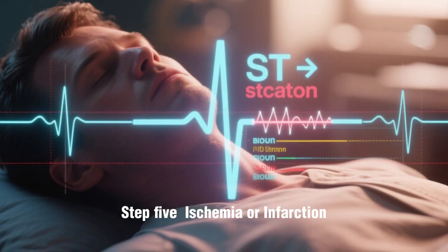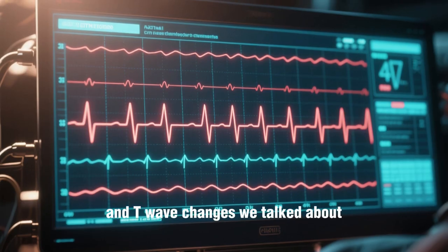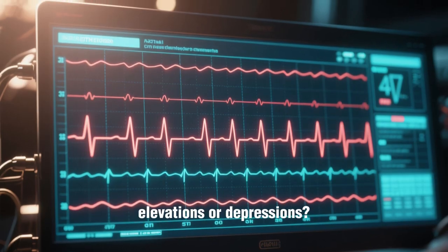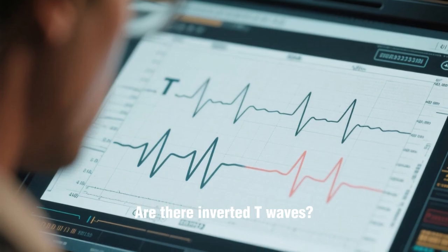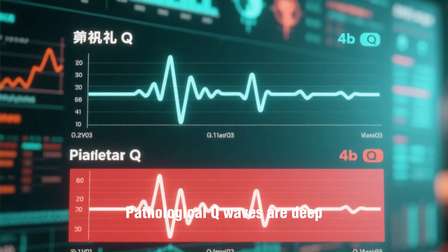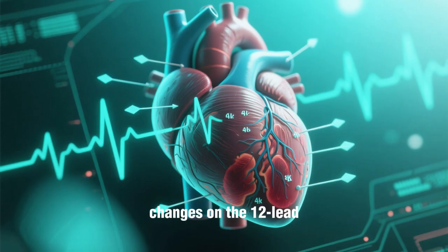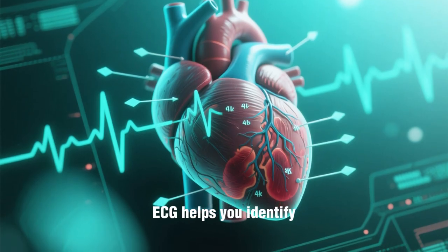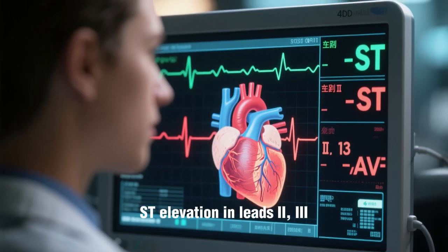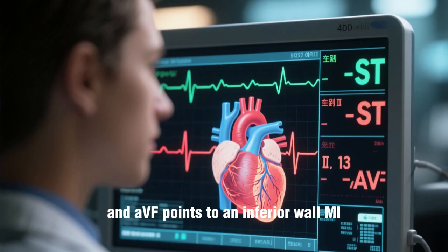Step 5. Ischemia or infarction. This is where you look for those critical ST segment and T wave changes we talked about. Look through all 12 leads. Are there any ST elevations or depressions? Are there inverted T waves? Are there pathological Q waves? Pathological Q waves are deep, wide Q waves that can indicate a previous heart attack. The location of these changes on the 12-lead ECG helps you identify which part of the heart muscle is affected. For example, ST elevation in leads II, III, and aVF points to an inferior wall MI.